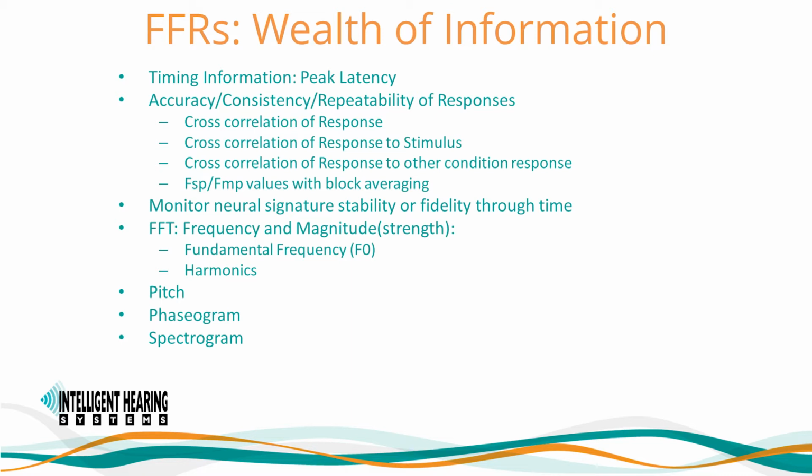The cABR FFR analysis screen also offers a fast Fourier transform, or FFT, of the response, where the response is converted from the time domain to the frequency domain. This FFT provides frequency and magnitude or strength information for the fundamental frequency and harmonics. You can also obtain pitch tracking, periodicity, pitch strength, and pitch error information.